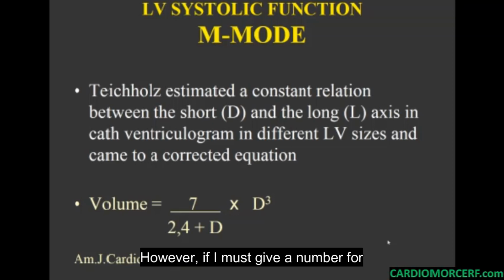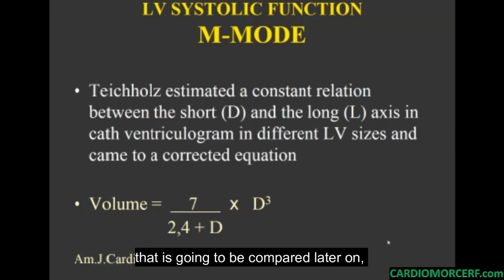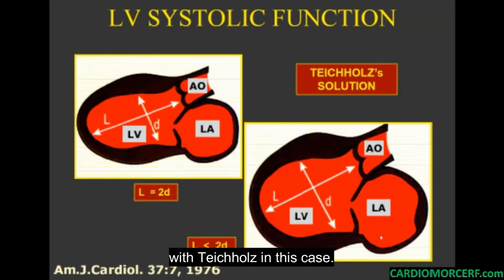However, if I must give a number for ejection fraction that is going to be compared later on, I rather offer this and report the method I used, hoping that the patient will return to the same laboratory, or at least will not have symptoms that prevent comparing the ejection fraction with Teichholz in this case.